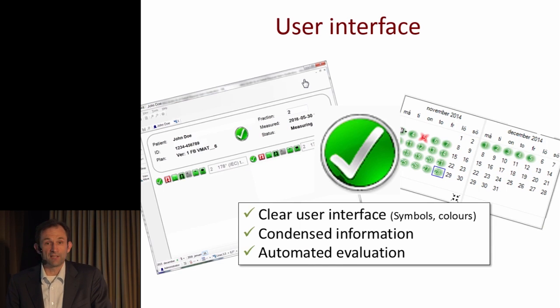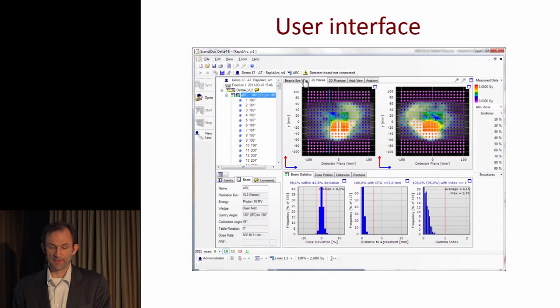You want to have a very easy to use interface. And we have created a clear user interface that uses symbols and colors. And all information is very condensed. And also, it's important to have an automatic evaluation in this user interface.